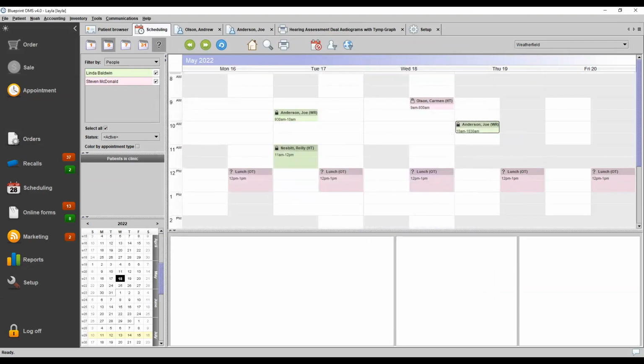The last thing I wanted to show today is our template tool. So in addition to the 5 new templates released into your system, we have different variations that were released on our website that if you'd like, you can add them into your Blueprint system. So to access these, we're going to go to our website.